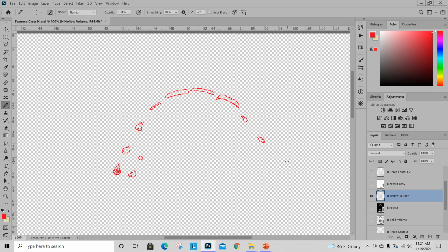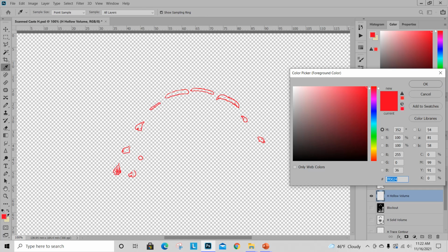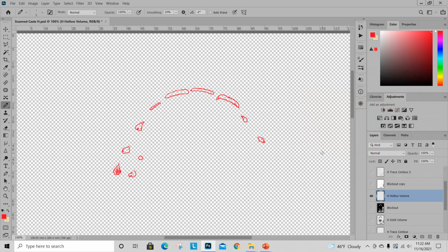And that's how you do the first method for creating a hollow volume overlay. Again, big things that you can run into: if your mode isn't RGB color, your strokes aren't going to show up in color. If you need to pencil something in but your pencil isn't in the right color, you change that by clicking over here and dragging your mouse to get the same color as your stroke. So, okay, that is method number 1 for creating a hollow volume.